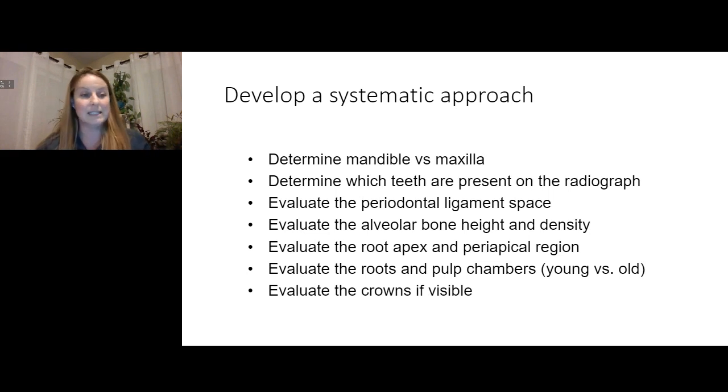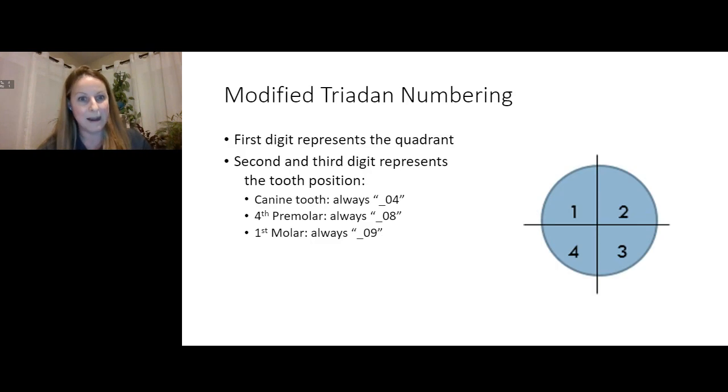We're going to look to see, is this an old animal? Is this a young animal? Has that tooth been dead for a long time? How can we know all of these things? And then the least important thing to have in your radiograph, honestly, it's good to have, but the least important part is the crown. Why? Because you can see it when you look into the mouth. Everything else absolutely needs to be there because you can't see it. But we need that bone height. We need that apex. We need 3 millimeters around that apex.